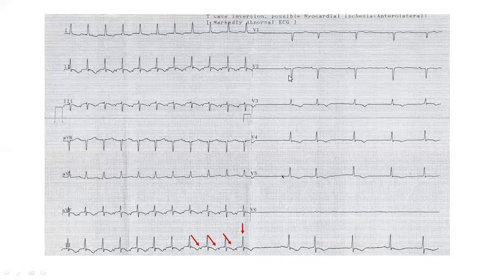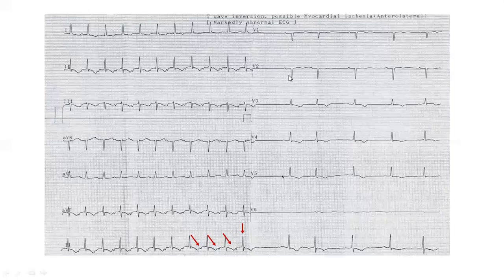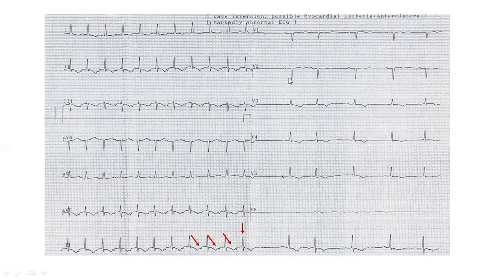Abrupt termination. Termination तो आपको कुछ help नहीं कर रही है ना, यहाँ बता दिया. वो atrial tachycardia. Why is this not sinus tachycardia? Any smart people, participants में से कोई है? हाँ?